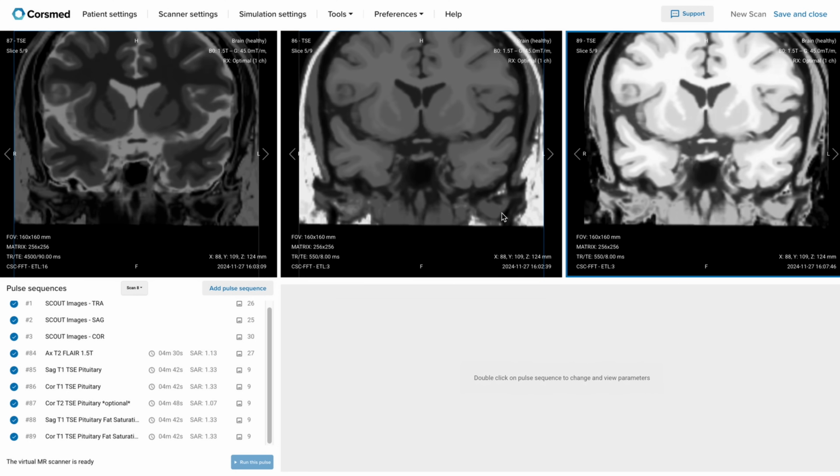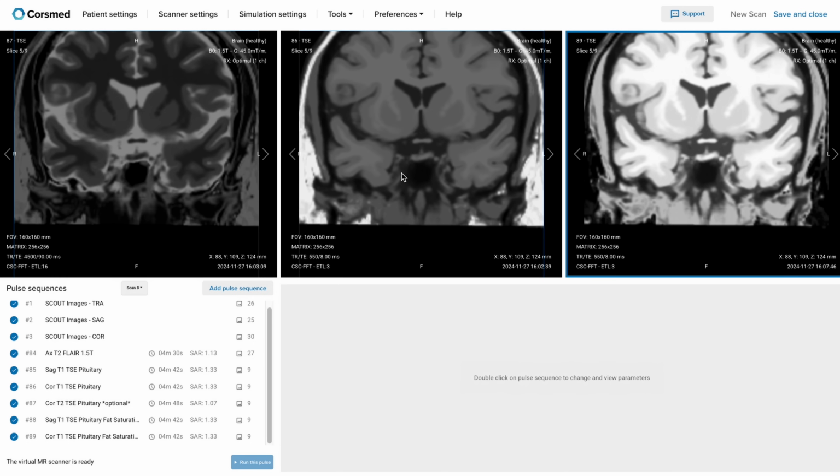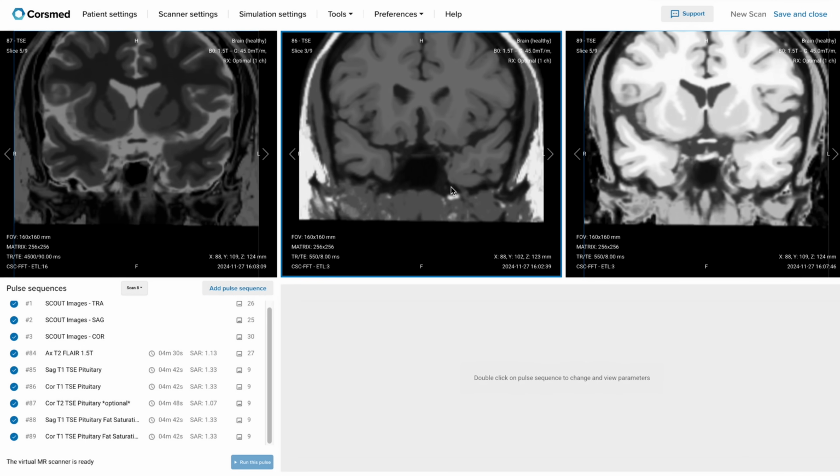These are the key structures we need to analyze for a successful pituitary MRI scan. We must always ensure the optic chiasm, sella turcica, clivus, and sinuses are represented and displayed clearly. Also, we must always consider the surrounding tissues in this region, as this area is particularly tricky. The variation in tissue densities here can lead to chemical shift artifacts if we don't take them into account.